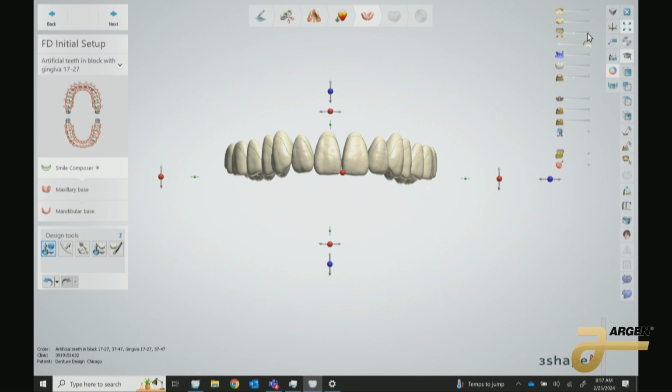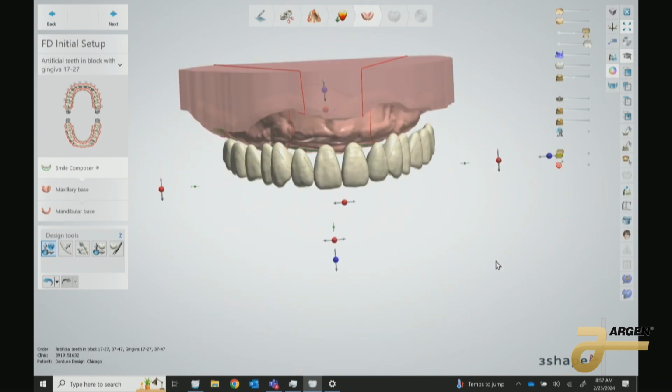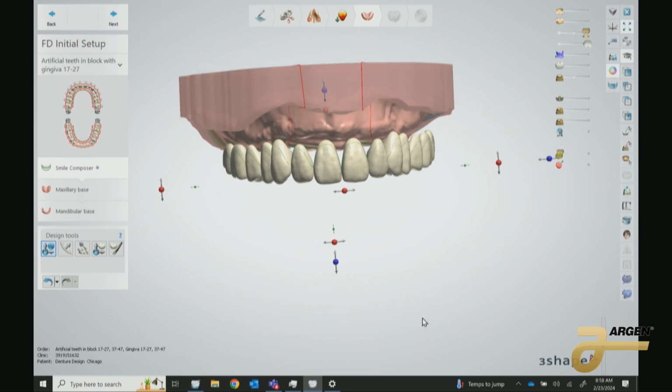So what we're going to start with is the upper. When you're setting your digital cases, all of your teeth are kind of going to be referring digitally to where your upper anteriors are. So you want to get your upper anteriors in a decent space. Then your lower posteriors, get those where they need to be. Then we double check where are the upper posteriors now, make sure they're still within function. Lastly, your lower anteriors. So when you're doing analog, everybody has kind of their own method for going through this. Like I set these and then this and then this. Digital, it works best if you're going upper ants, lower posts, upper posts, lower ants.